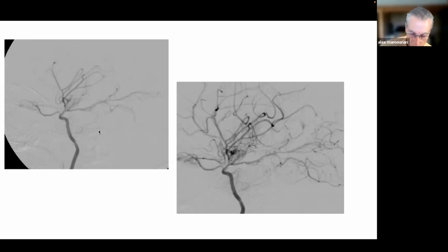Here's a patient with Moyamoya disease. This disease, as you know, results in a stenosis here in the distal internal carotid artery, and probably in stenosis here involving the middle cerebral and proximal anterior cerebral artery. And this network of collaterals here coming from the basal ganglia is what gives rise to this name Moyamoya, which I understand means puff of smoke. So this is the puff of collaterals that arise to support the distal vasculature in these patients with this proximal stenosis, really of unknown cause.